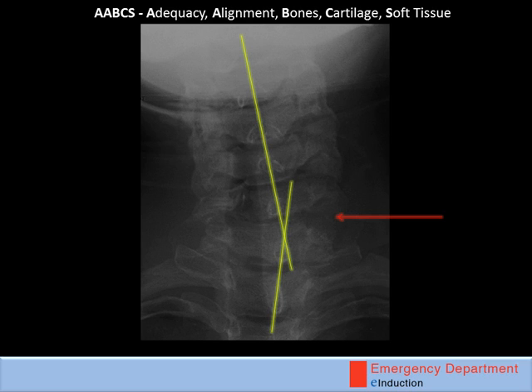So this is probably how your lines looked. The top spinous processes are bifid, so you have to use a point in the middle for your line. They seem to cross around the C6, C7 level. And when you come to look at your cartilage and soft tissues, there seems to be a radiolucent gap on the patient's left at the C6-7 level, and there's no pneumothorax or obvious fracture to the lateral processes. This alignment change is consistent with a unilateral facet joint dislocation, with one facet just perched on top of the one below. This patient's going to need immobilisation, a CT scan, and a spinal opinion.